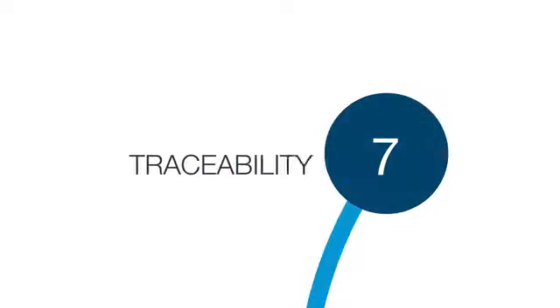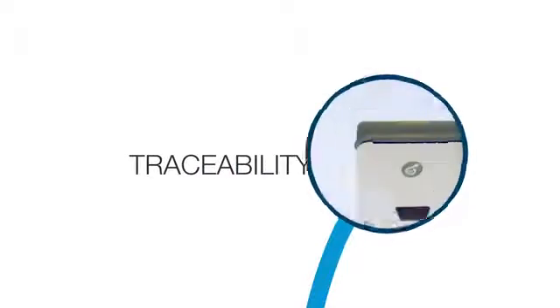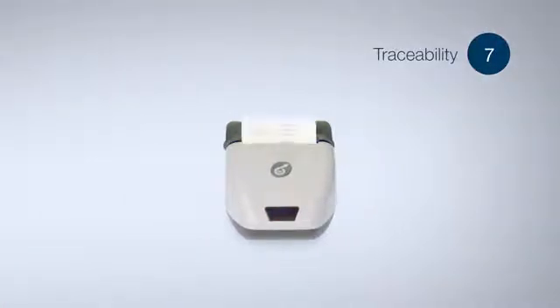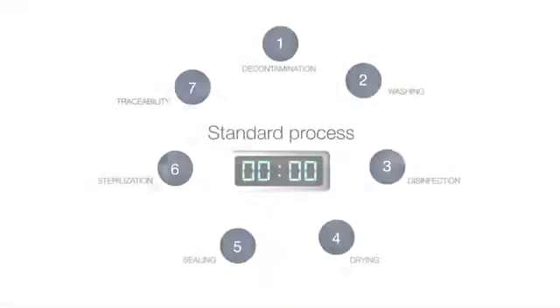This step associates each instrument with the sterilization cycle it was treated with. This constitutes an unequivocal identification, and each instrument should be recorded in the patient's medical records.